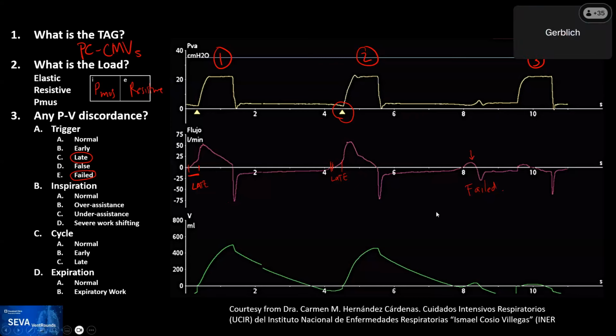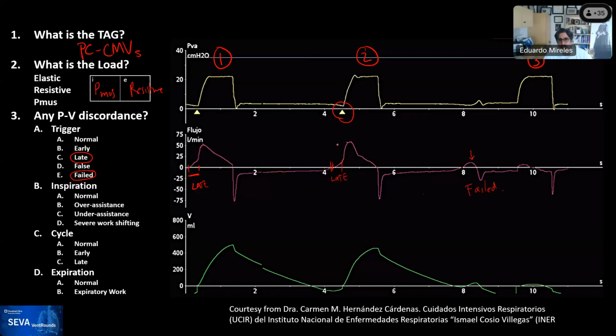I mean, the flow went down significantly. In which breath are you talking about? The third breath, the failed breath. Yeah. Yeah, but it's not a flow trigger. It's a pressure trigger.